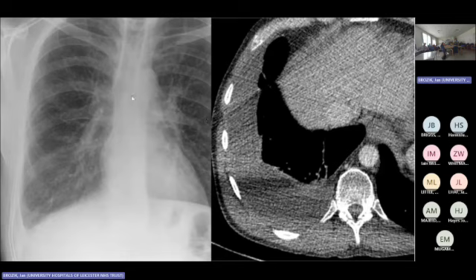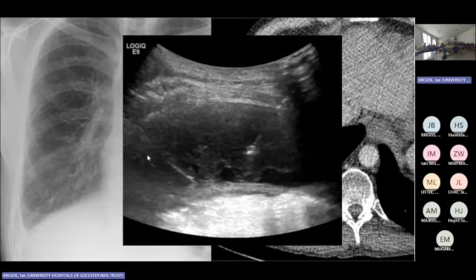But the next question is: are there any septa? Well, I don't know. There could be. Unless there are multiple gas bubbles, it's very difficult to comment on presence of the septa, and you want to know it for the future management. And the easy peasy thing is just do the ultrasound. Every imaging modality has its weaknesses and strengths.